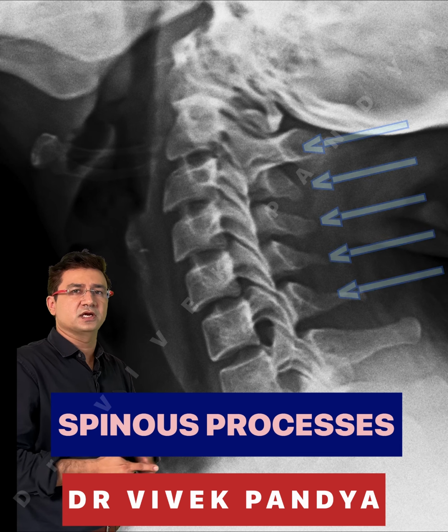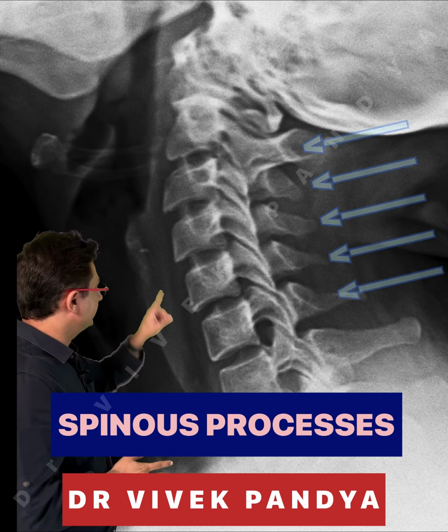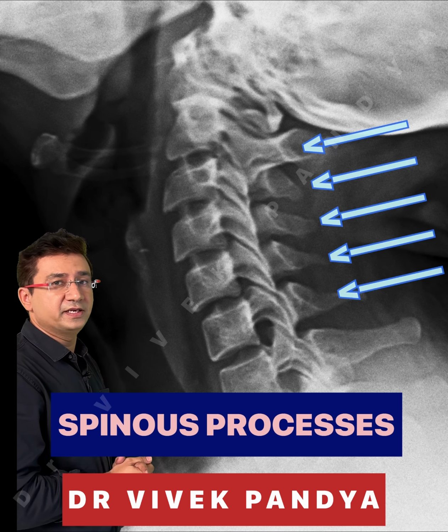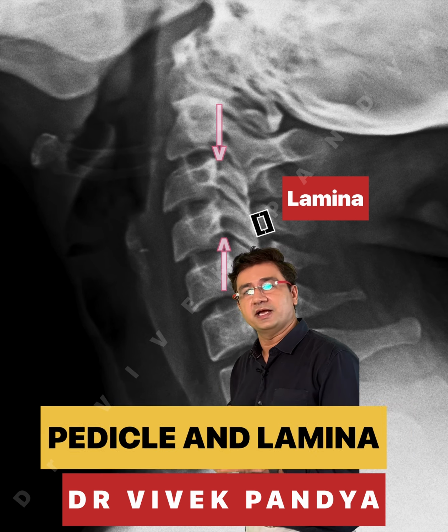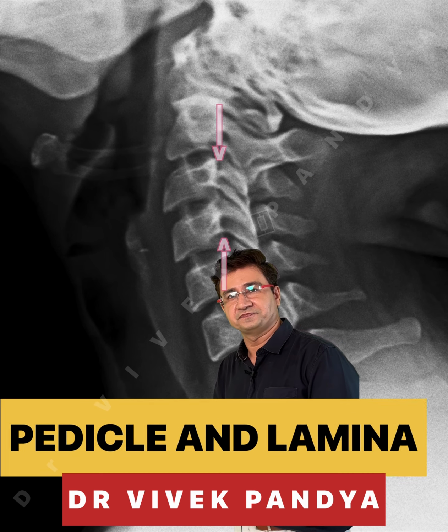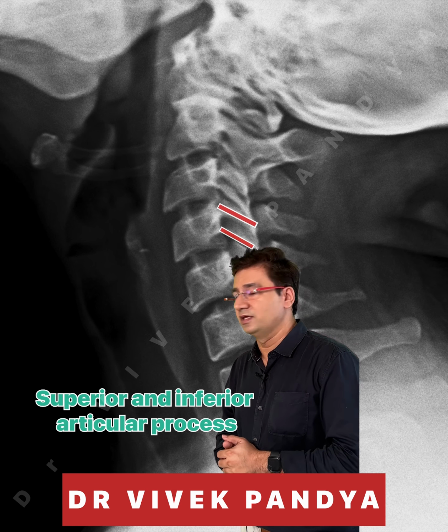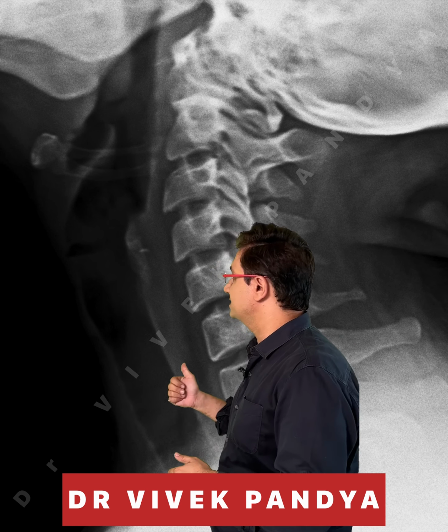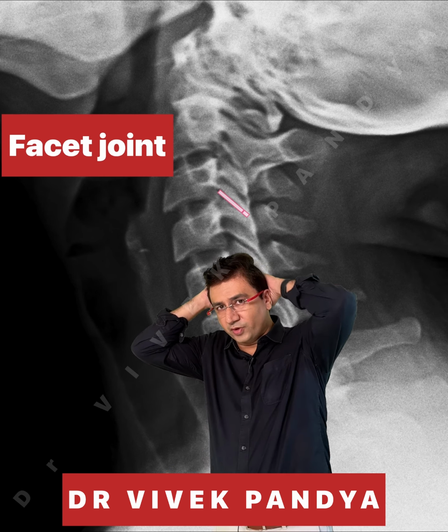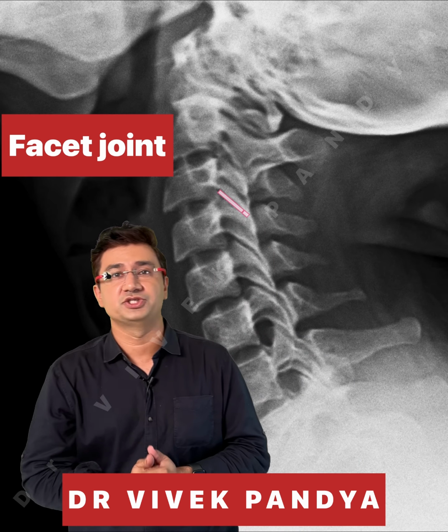Then next come the spinous processes of the cervical vertebra. The posterior elongated bones behind each cervical vertebra are the spinous processes. Then comes the pedicle and lamina of the cervical vertebra, as you can see here. Okay. Then the superior and inferior articular processes are seen in this image. So the joint between the superior and inferior articular process is known as the facet joint.